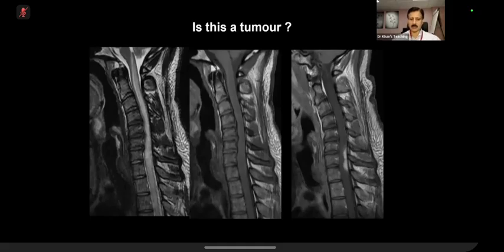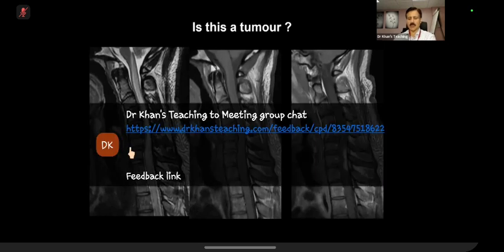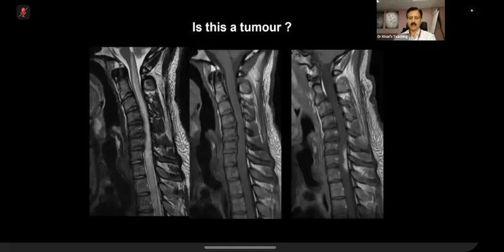And this is sarcoidosis. And you cannot pick it up just on the basis of this imaging. But you remember when I showed you brain sarcoidosis, I told you my mantra: know your pathology and make your radiology. What happens in sarcoidosis? It is basically a meningeal process. So from the meninges, it can involve the pia mater. Then it goes through the Virchow-Robin spaces, which surround the vessels going into the brain. We're talking about the brain here. And from there it goes in.